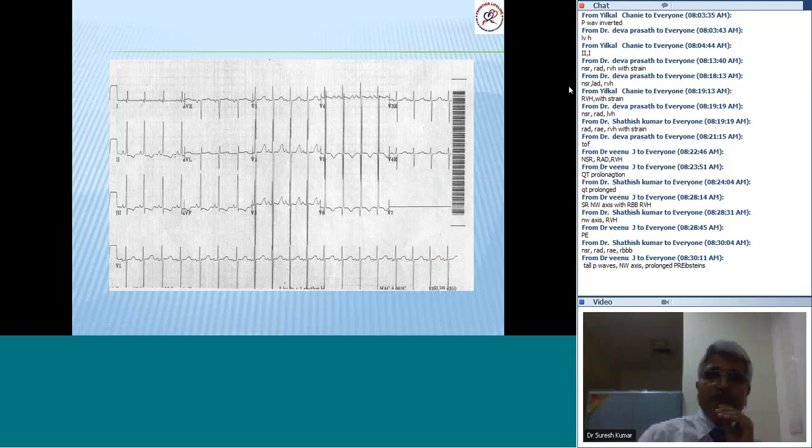I'm sure that you will come with a diagnosis in this. Come on. It's a big jump from Epstein, something totally different.